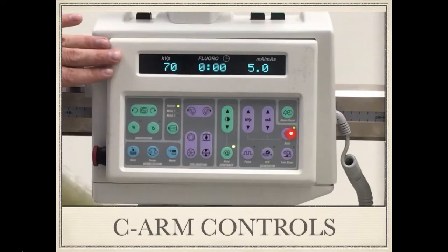If you see this button is lit up, this is the auto setting, which is the auto KV and auto MA button. The machine defaults to a certain setting on its own, and this button is always lit up when you switch on the machine. However, if you want to change the preferences, you can manually change them by using these MA and KV buttons.